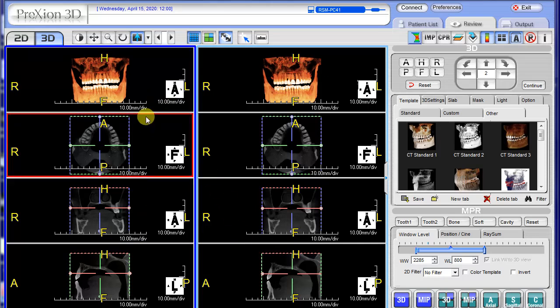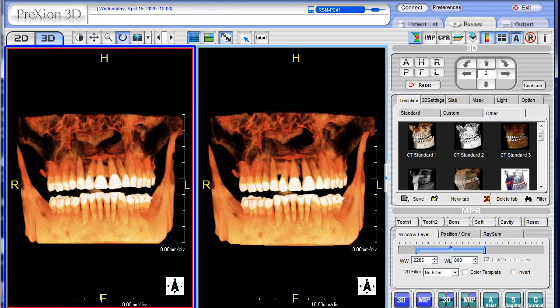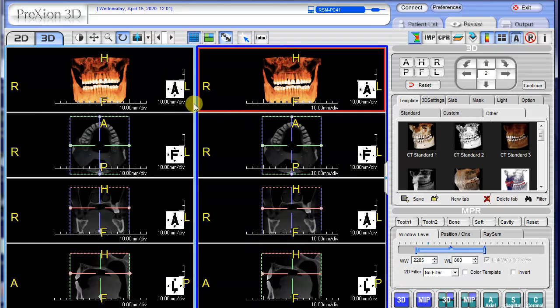So if you want to load one study up at a time, you can do that. Just double click here, and then you could load up one particular study. That is to say, using this little box here, and it'll change it. Now if you hit the arrow, it'll change it from study back to study. And so just this little highlighted box here does that. If one wishes to return to the side-by-side format again, just click this blue multi-boxed icon here, and you'll go back and forth again to the multi-data screen.